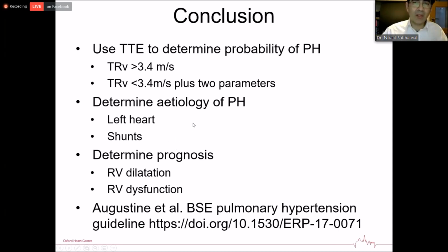If they've got pure lung disease, it's more challenging to determine what's going on. But we can also determine prognosis if the RV is dilated, if there is RV dysfunction, by whatever method you want to use. So feel free to do RV tissue Doppler, look at the S-wave. If you find RV dysfunction with RV dilatation, they're immediately in a poorer prognostic group.